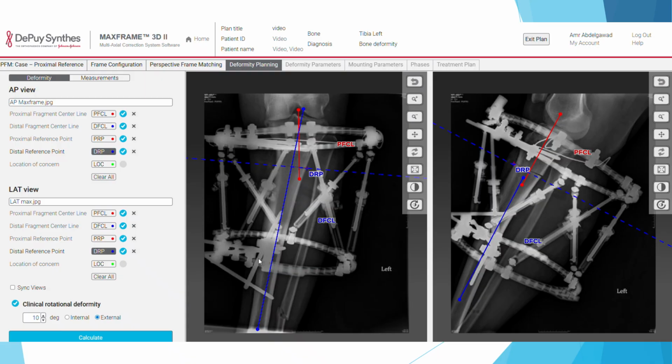So you will have basically the line here will come here. The bone will become straight from here. You will get a 12 degree. So you will move this part here 12 degree. This is what will happen if you do this, okay? This is not the best biomechanical, as I'm going to show you in the coming part, but this is what will happen in this case. So let's stop here, and I'm going to show you how that will look in a diagram.